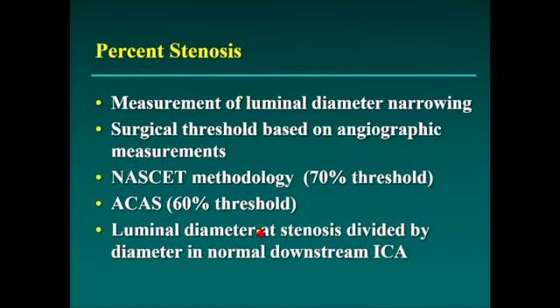A couple more things to say about pitfalls, and that one would be abnormalities that come from measurements. The measurement of the luminal diameter will not be the same in grayscale, power, and color Doppler, and that's because of what they're doing at that edge of the vessel, and I'll get into that in a minute. We don't tend to measure diameters of stenosis, but there has been some enthusiasm for something called the minimal residual lumen, or measuring how much there is left.